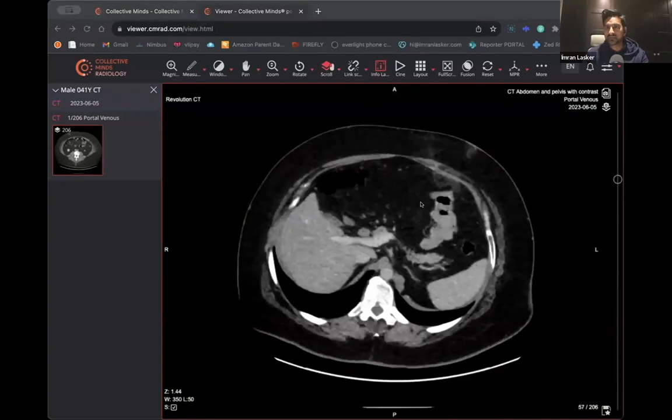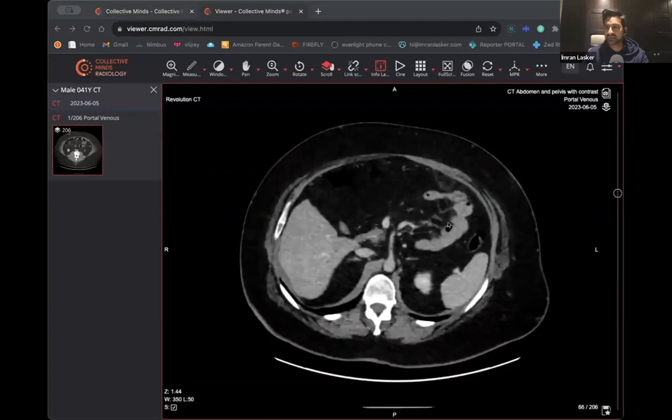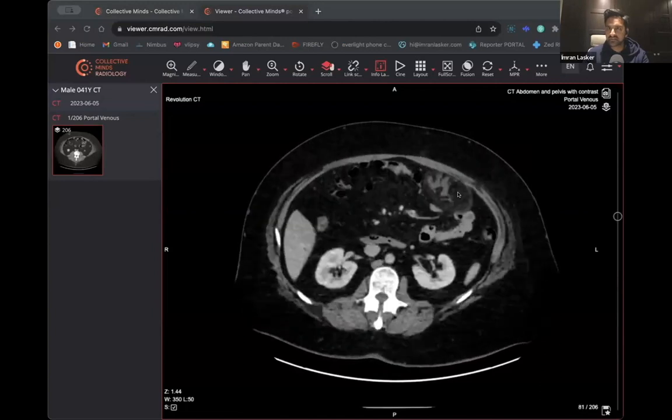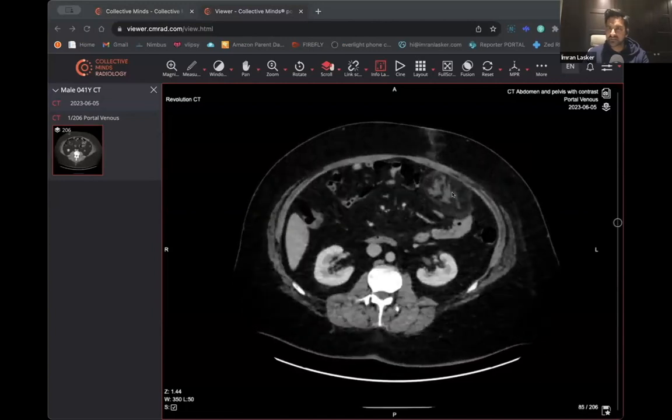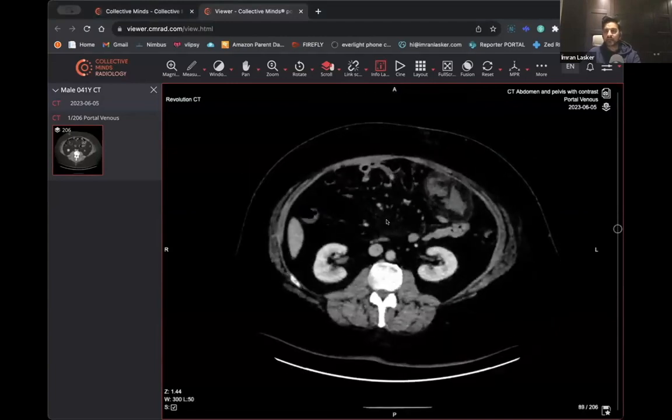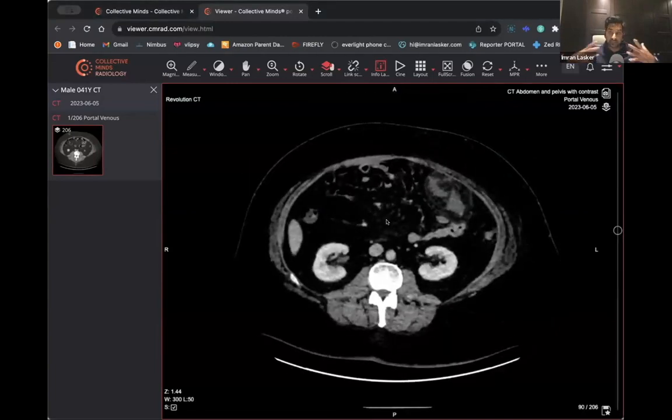So you've got your mesenteric side, and then you've got your anti-mesenteric side, right? This area over here looks very spherical, with lots of fluid located within that region. And actually what this would be in keeping with, oh hang on, have I got the wrong windows? This would more likely be in keeping with an omental infarction, a bit like when you get an epiploic appendagitis. Sometimes you get these post-surgery, sometimes with vascular pathology. There are lots of reasons for someone to have an omental infarct, and this is most likely what this is.